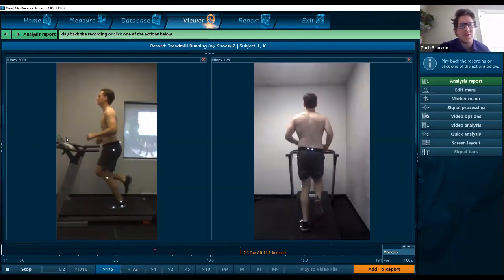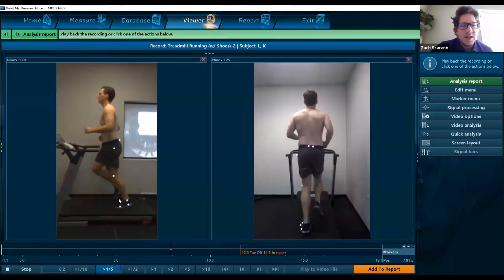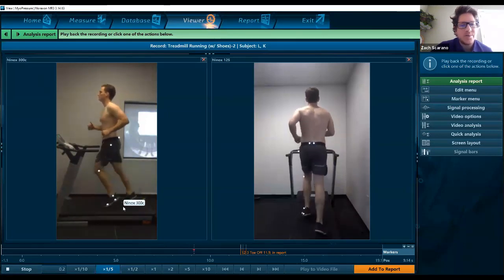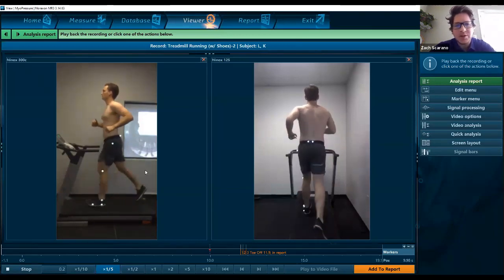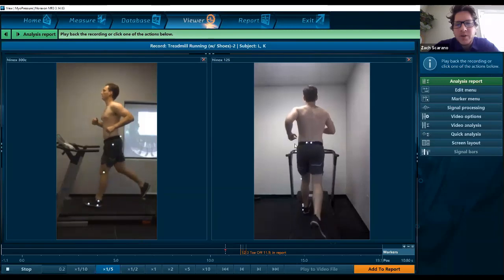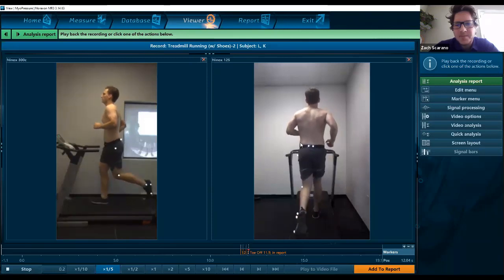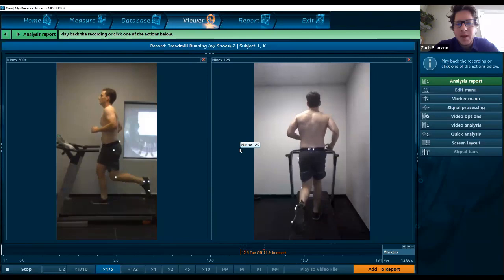For instance, you can see here on the sagittal plane, we have one at the hip, knee, the ankle, and then I decided to put one as the flat part or the sole of the shoe, as opposed to just going directly to that 5th metatarsal. You'll see why I did that here in a second. On the posterior view, we've got them set up a little bit tight here, but essentially to represent the PSIS there, give us a nice straight line to look at some pelvic drop.